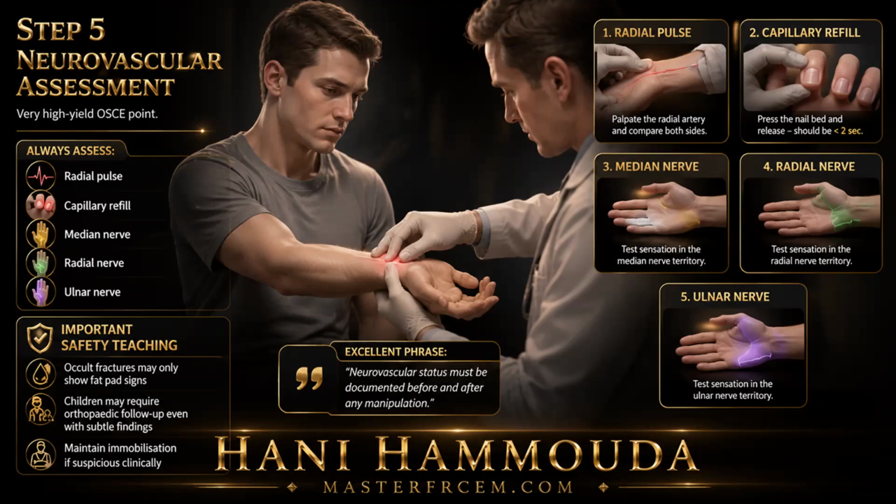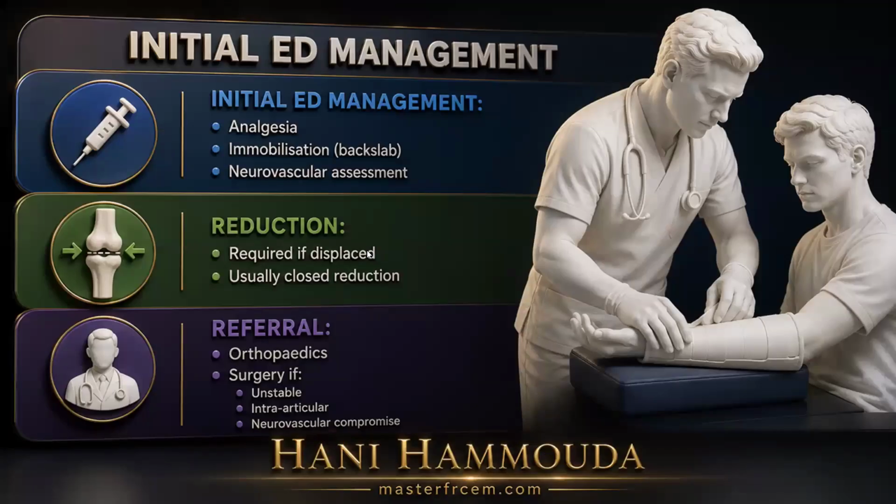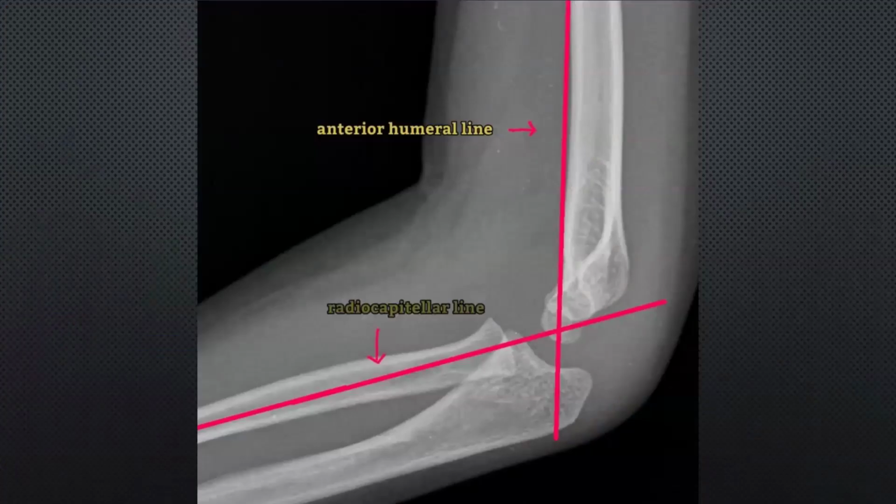Okay. We will stop here, guys. I think we almost finished. So they can show you any X-ray. Is this one normal or abnormal?